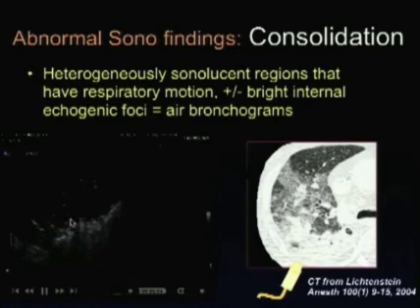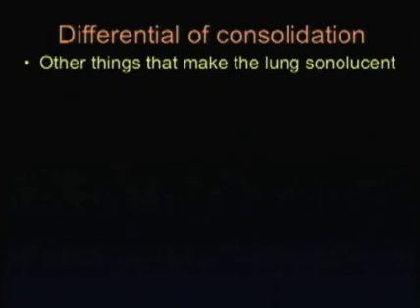And if this was an ultrasound probe placed here in this patient's CT, this area here would show up as a consolidation like this, and this area here would probably show up as areas of multiple B-lines. But the back area of this consolidation here, with its irregularity and its transition to increasingly aerated lung, will give this shredded appearance with these small reverberation artifacts coming down from here, caused by the interstitial edema in that region.